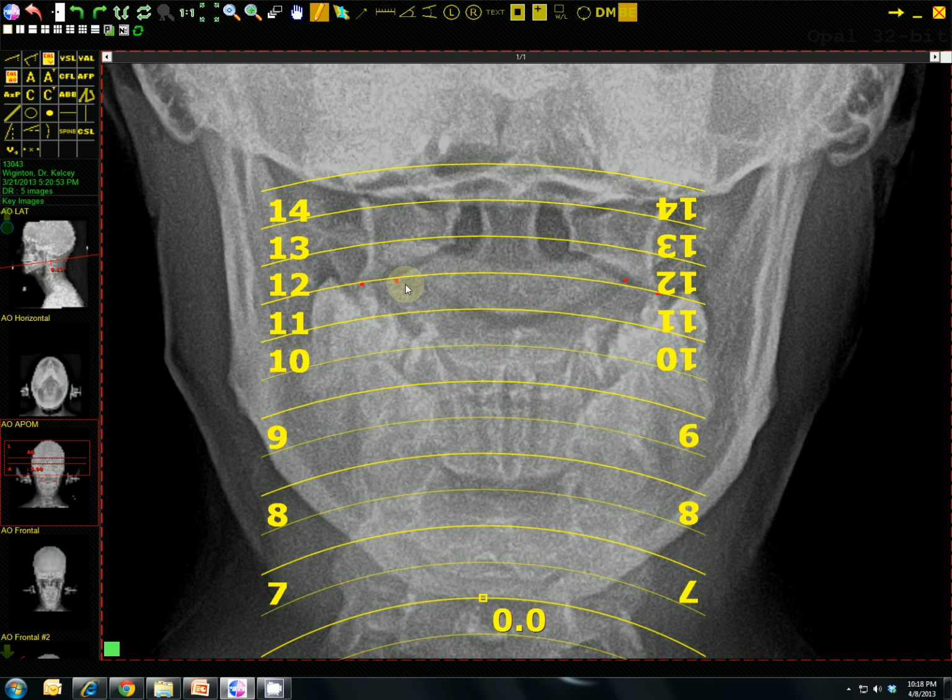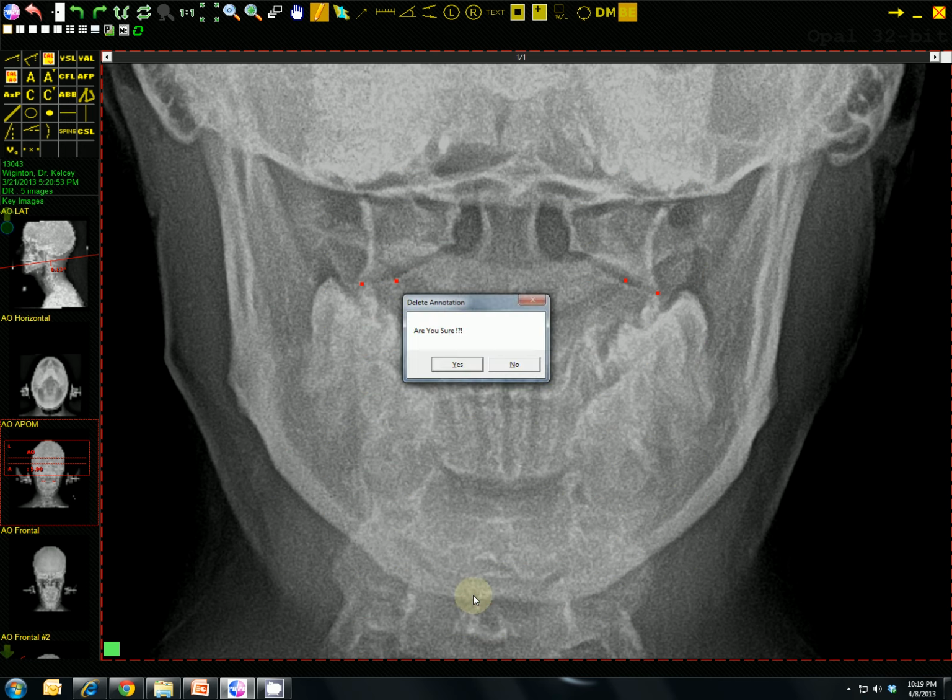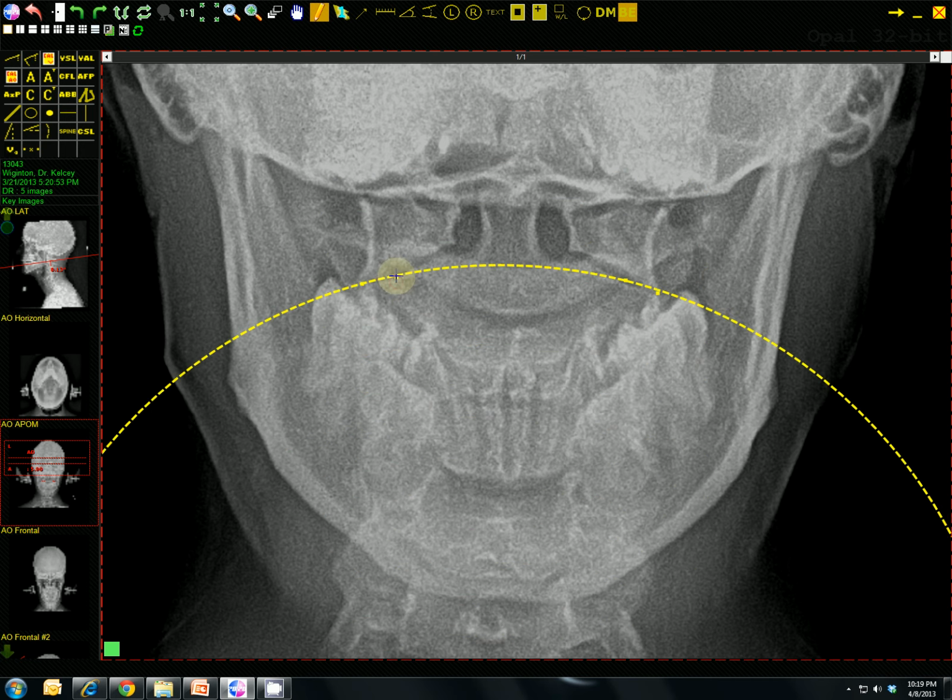That would give you the rough estimate of that particular circle. Obviously, that's not for this circle, that's just for the practice. But in any case, it would be 17 divided by 2. So 8.5. Let's go ahead and erase this template, though, because we want to make sure that this is back up where it should be.